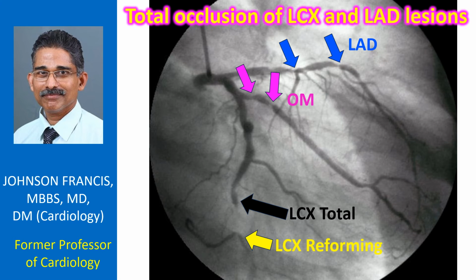Thus, what appeared to be a single vessel disease from the ECG showing hyperacute phase of inferior wall infarction with reciprocal anterior ST segment depression, which could occur due to isolated right coronary lesion, has turned out to be severe triple vessel disease, possibly requiring coronary artery bypass grafting. The culprit lesion which has caused the infarction in this case is possibly the left circumflex occlusion.